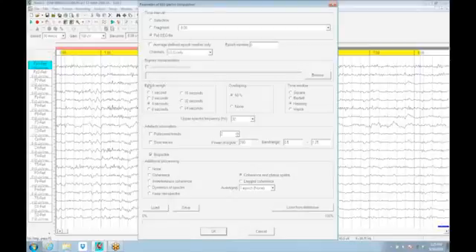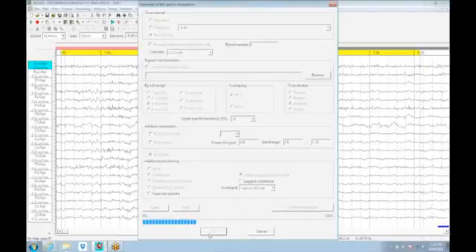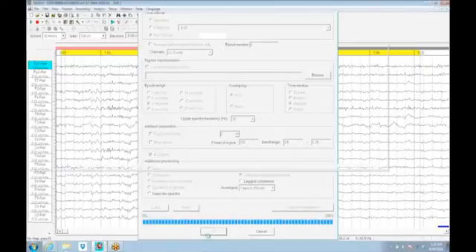Now, I have it set for a 4-second long epoch, which gives us quarter hertz resolution at the end, a very fine FFT. Some of the older databases only give you 1-second long epochs, which give you a more blunted view of the Fourier. And we'll take a quick look at that just to let you take a peek at it.